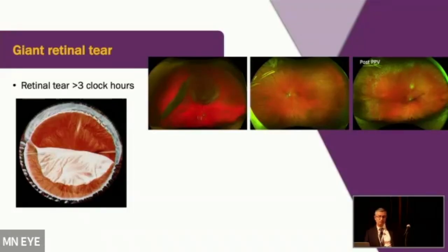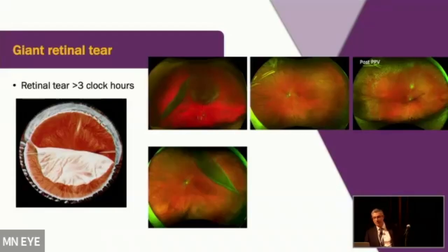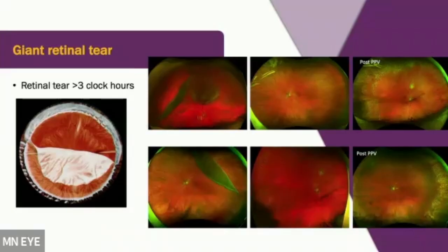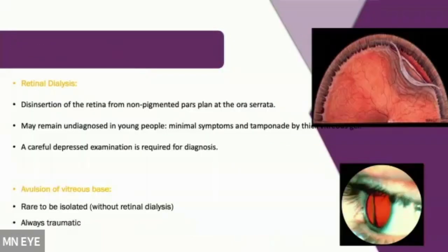He comes for follow-up, week 1, month 1, month 3. Now this is the left eye, horseshoe tear. It's a giant retina tear again in this eye. Again, the right eye is good. So the left eye also underwent surgery. So these are usually giant retina tears, either with trauma or there is a predisposing condition, high myopia, or just some connective tissue problem, that when the retina tears, it almost unzips, 3, 4, even longer clock hours of tears.